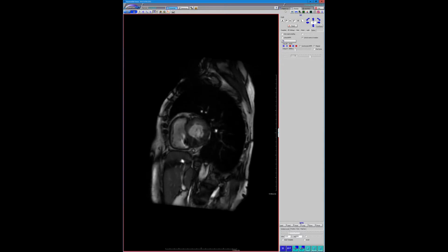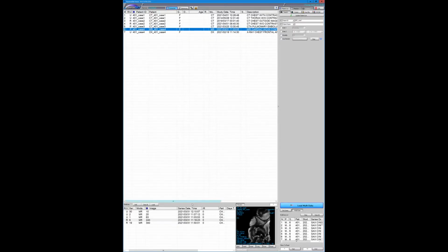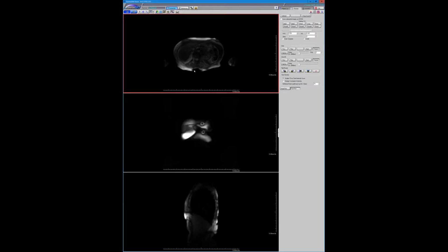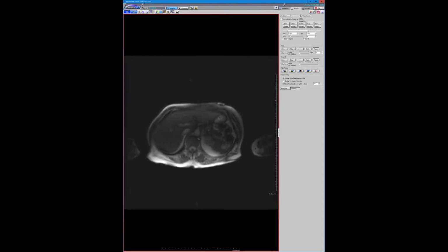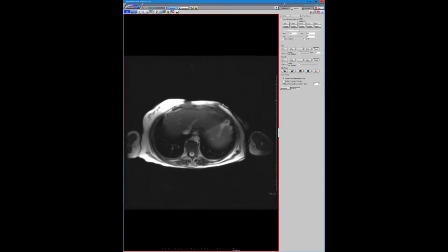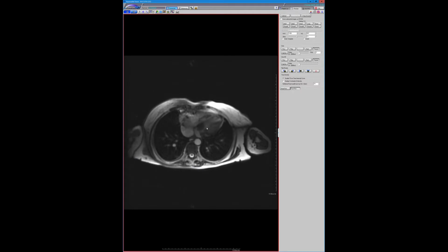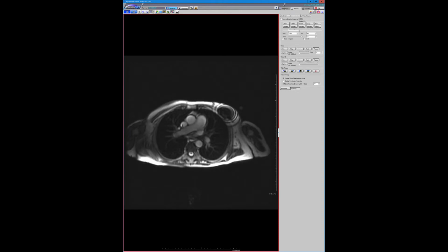It's a little down, but not dramatic. And it took me a while, longer than it should have, to figure out what the heck this was. And then once I just kind of sat back and said it's so low signal, and I was scrolling through, and then it was here, and I'm like, oh, it's got to be just raging caseous MAC.